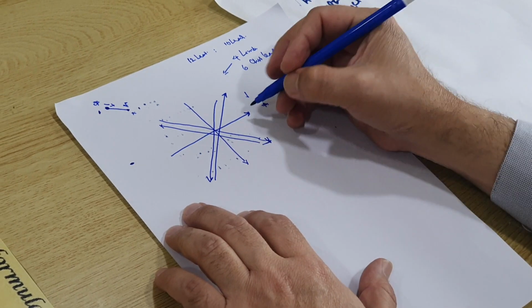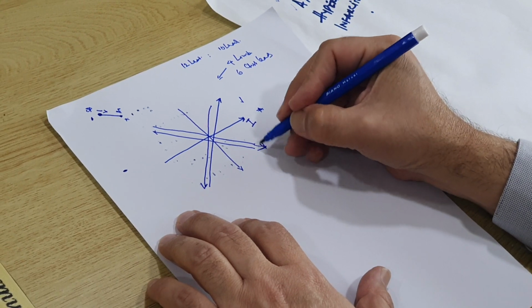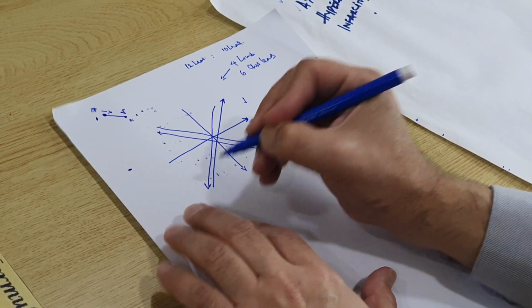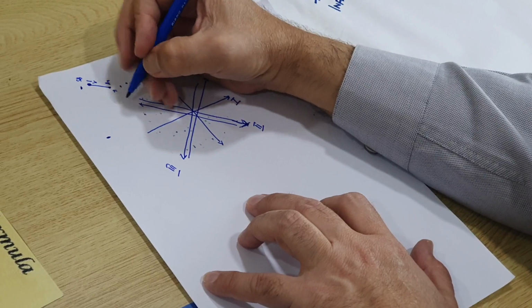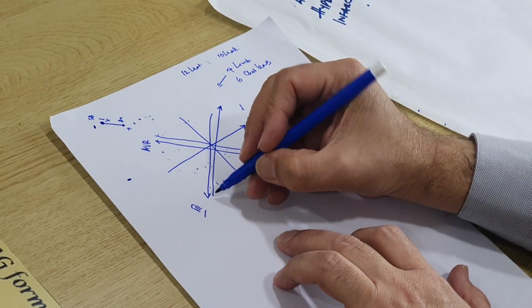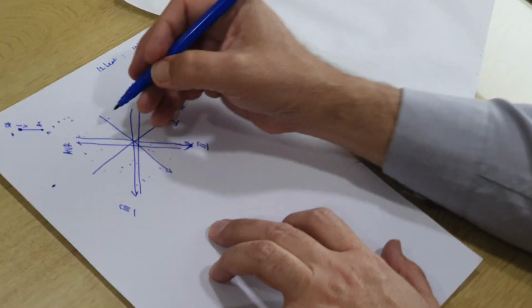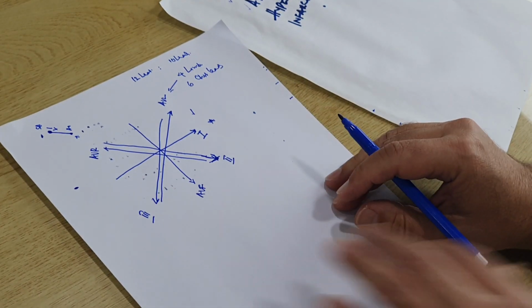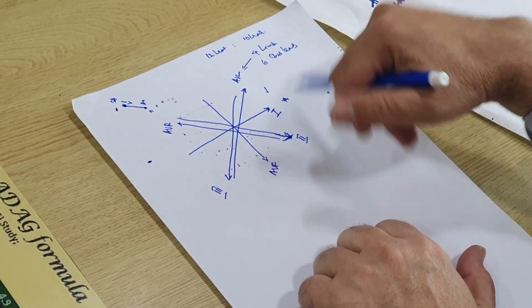I'm going to label them now. This one is lead 1. This arrow pointing downwards, this is lead 2. This arrow pointing downwards is lead 3. This one pointing towards the right shoulder is AVR, which is this one. This one pointing towards the left shoulder is AVL. And this one coming exactly in the middle is AVF. So in this way, the limb leads will cover the whole of the heart, from the right to the left side.